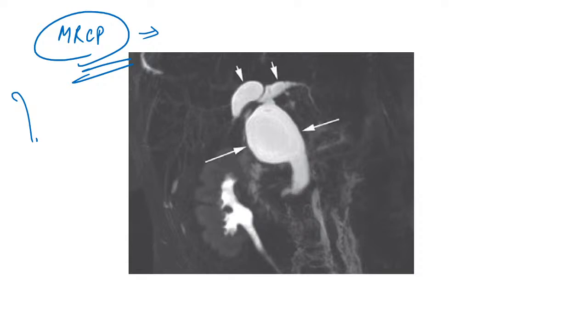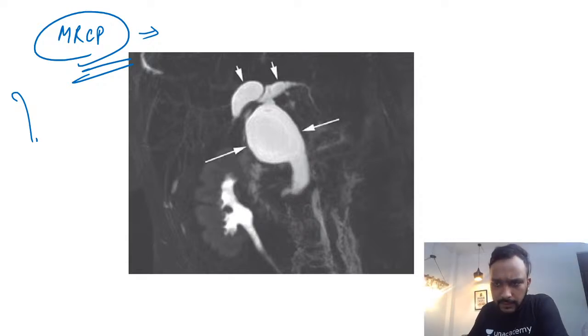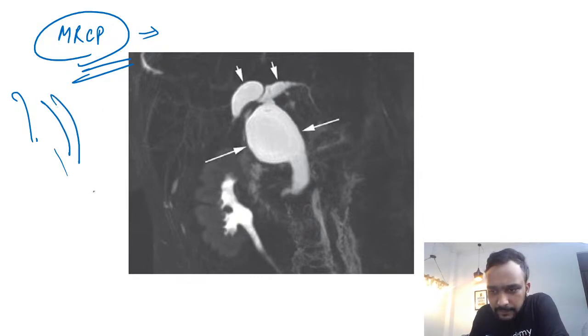Double duct sign. No. Is audio not fine? Audio is not good. Dr. Teja Kumar, is there any problem with the audio? No, this is not double duct sign. Nimisha, in double duct sign you are going to see dilated CBD. Not audible.